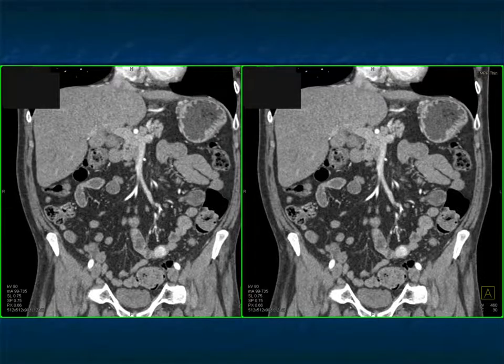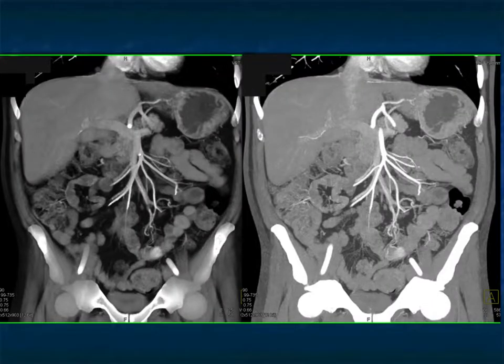Here you can see one dominant lesion. Also, if you see small bowel Mets, you better make certain you're not missing metastasis to other organs. Again, there's the feeding vessel, very nicely shown, right there.